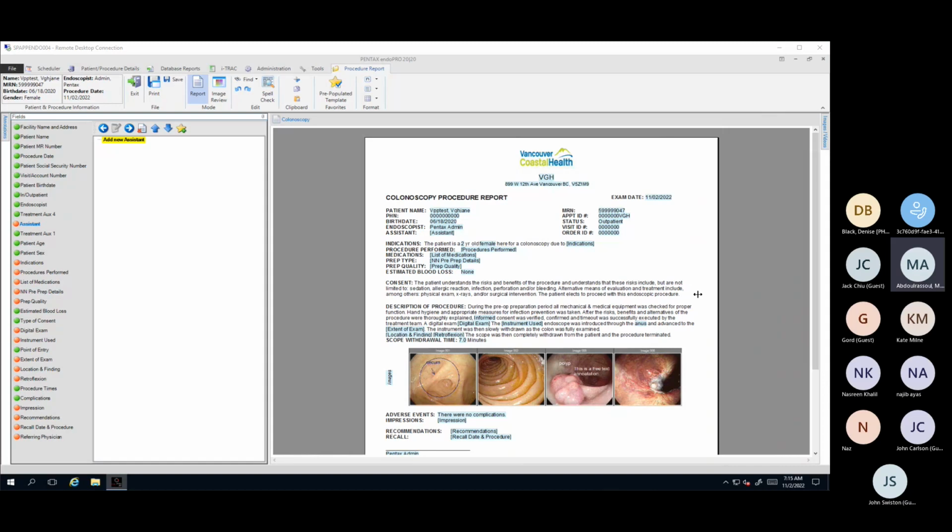So let's say 5 years from today, if you come and say, hey, Munir, I want to see how many of my patients had a mass, for instance, I wouldn't be able to pull that data up if you were to type that within this space or within the highlighted blue spaces. Okay, so very important there. Furthermore, these highlighted blue fields are also the fields that will get populated with data as you go across filling them out using the field section on the left-hand side. Okay, and we'll go over that in just a moment.